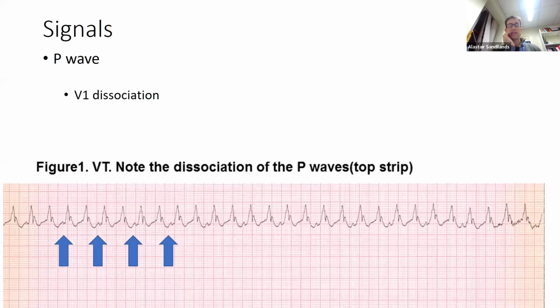So how can we tell it's ventricular tachycardia? This is an example of what we call dissociation. Dissociation is the complete opposite of complete heart block. So the ventricle is beating very fast. You can see that this is lead V1. You've got a big bunny rabbit's ear and then a small bunny rabbit's ear, so that's the other way around. Conveniently, I put the arrows where the sinus node is firing, and it seems to be roughly every 2 beats of VT that the sinus node fires.